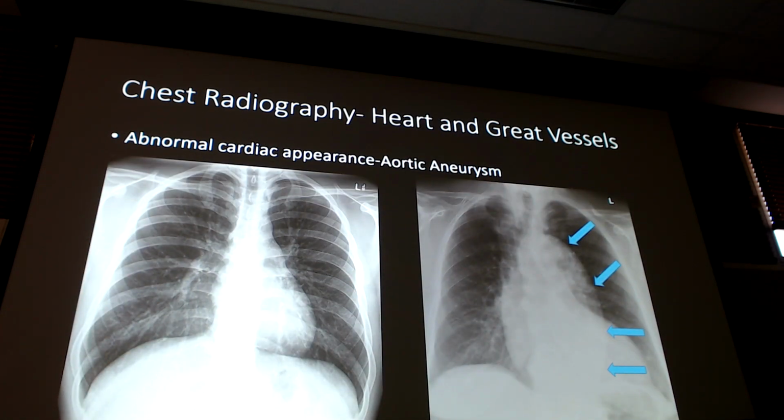Okay. Oh boy, this looks like the uncoiling of the aorta and hypertension, right? So how would I know on this? There's that, right? Even maybe a little bit here, maybe a little bit there, but really that guy there. How do I know on just x-ray whether this is an aortic aneurysm or whether this is just uncoiling of the aorta due to long-standing hypertensive cardiovascular disease or any of the other things we talked about?